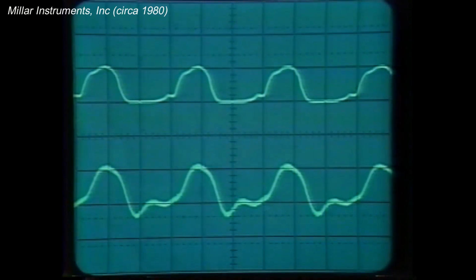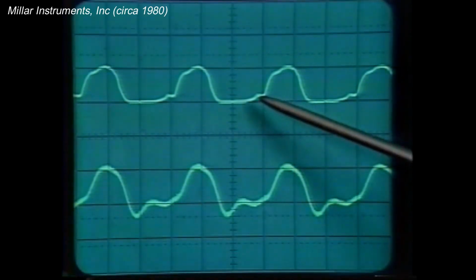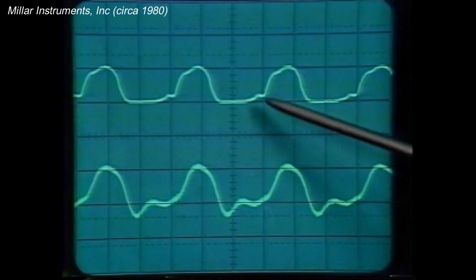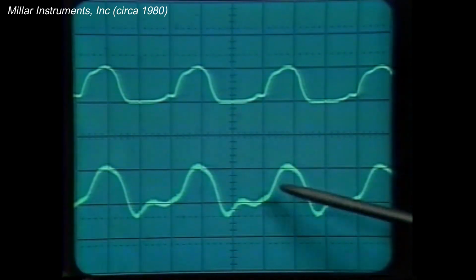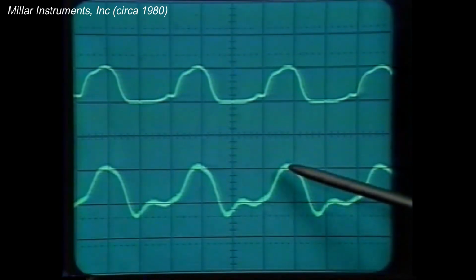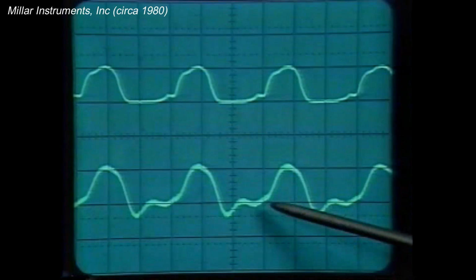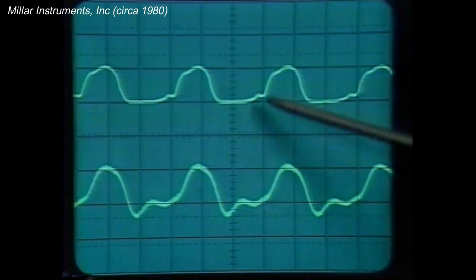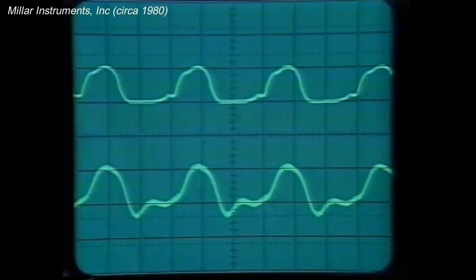Now let's once again introduce an air bubble into the system. Notice how we've lost all of the fine details of the waveform, and there is a very evident time delay. The start of the waveform is here on this trace, but it is delayed on the lower waveform. The shallower rise of the wave front would provide a dP/dt reading erroneously low.